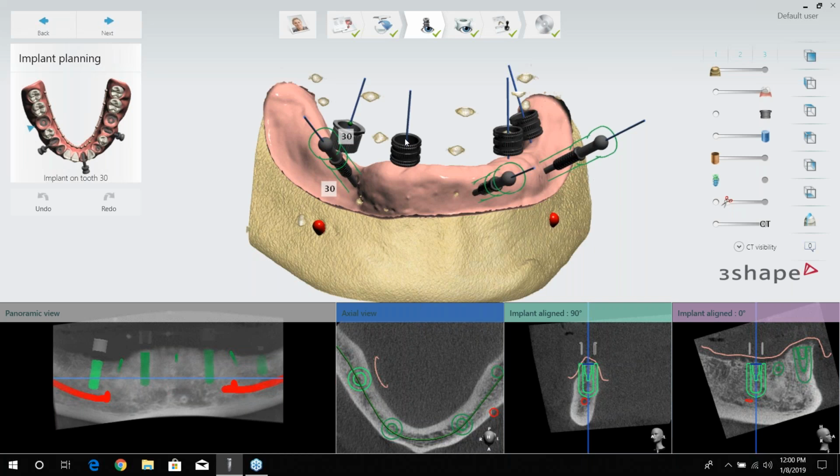There are some third-party ones that allow you to freely move them. But in the surgical report, it tells you what drill you would need to use, what the minimum length would be. But for most of the manufacturers that supply or make their own sleeves, it's going to have a preset value that corresponds with a combination needed for their fully guided drills.